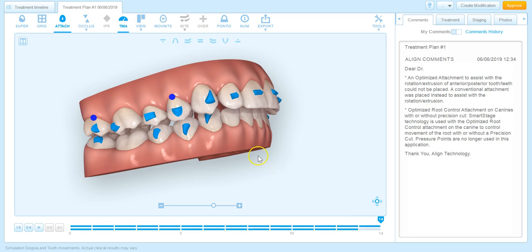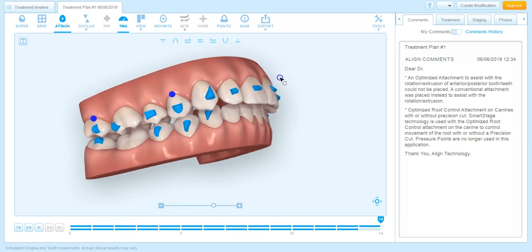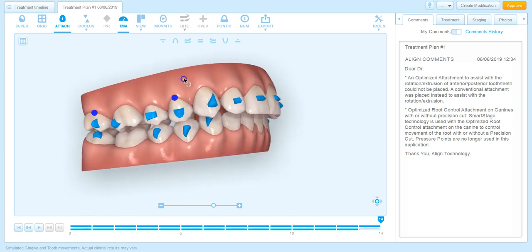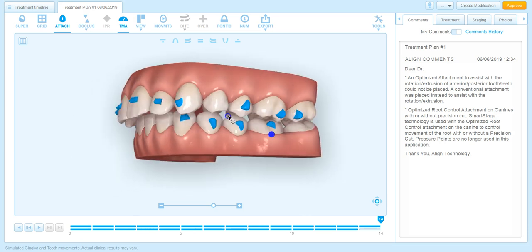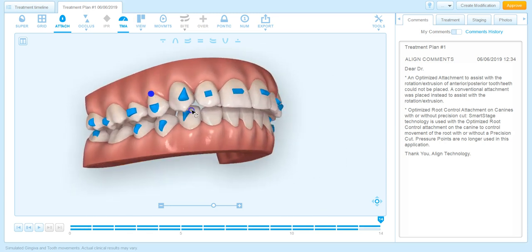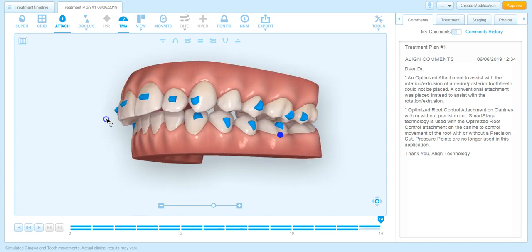So that's a very small file. The extension of the file is also known as an ADF file. So in some groups you'll see, hey, please send me your ADF file, and that's how you can export the ADF file. As a matter of fact, in our closed group, if you want to upload a ClinCheck for other members to see, that's how you would do it.